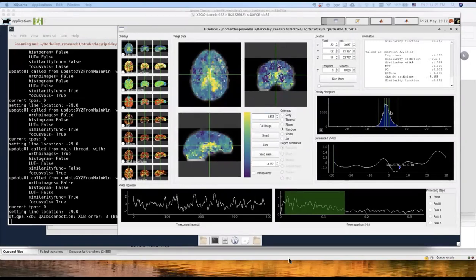In the middle right panel, you can see the distribution over voxels of these lag maps. The zero in this distribution is defined at the peak of the distribution, so it's arbitrarily defined at the peak so as to allow easy cross-dataset comparisons.